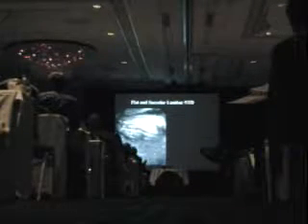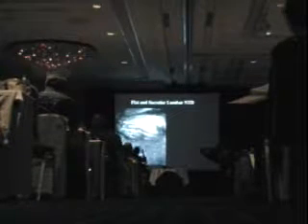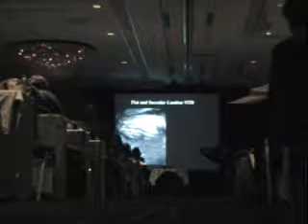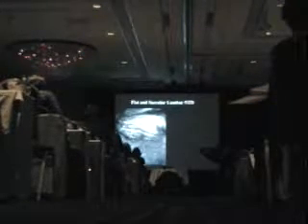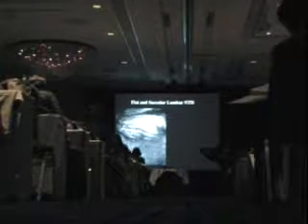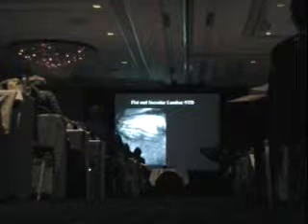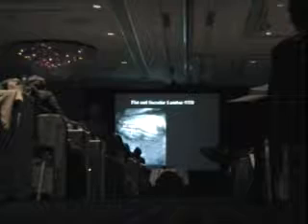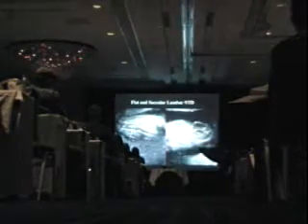Now, what do these neural tube defects do? It's very important to look at the spine, even if you look at the head and the head looks normal. You can still have closed neural tube defects with skin covering. These are the minority of the neural tube defects, but they can give you a situation where you don't have the head sign. So do definitely look carefully at the spine. And you can see sometimes in these long neural tube defects the widening of the posterior elements, here in this very long and severe defect.